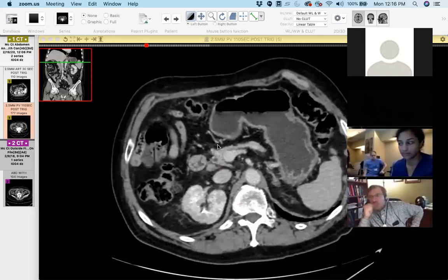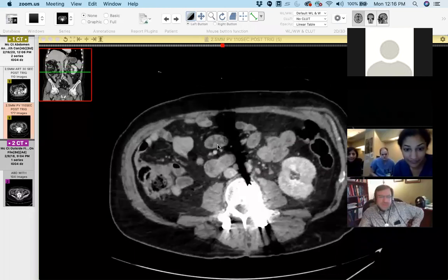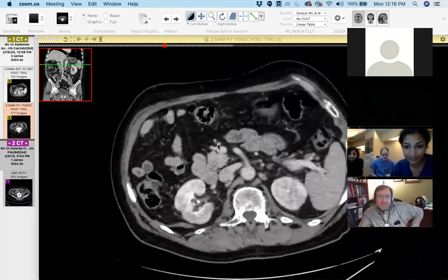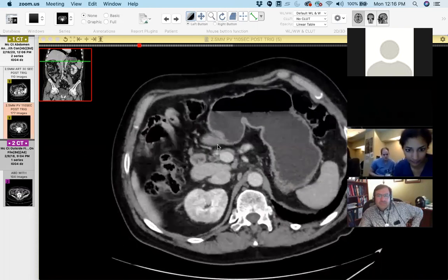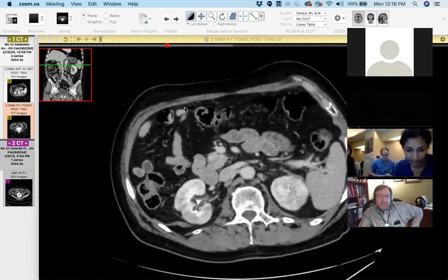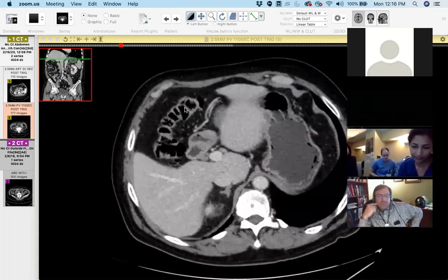So this is Arthi. It's a great segue from Arthi's striated nephrogram. So this is a follow-up exam. I'm going to withhold history. So pancreas and kidneys, what do you guys think?